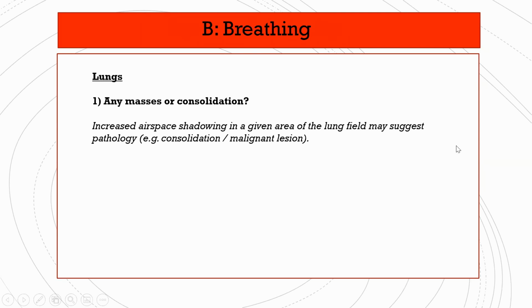zones. So you just divide the lung into thirds, and this will be the top zone, middle zone, and lower zone. It doesn't correspond to a lobe. What I see on the X-ray is the top zone, middle zone, and lower zone. So don't forget that. Don't get them confused with lobes, because you can't see the lobes in an X-ray. You can see the zones.